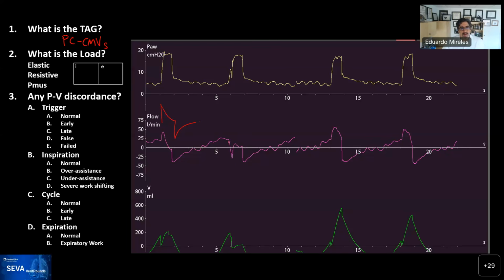And then during expiration, you see here the peak and an exponential decay, and then these oscillations, and then it changes again. The peak, it decays, and then oscillations again. A peak that is partially amputated, perhaps. It doesn't look as nice as this one. And then this one with a decay falls probably within 2 seconds. And each one of these little markers is a second.